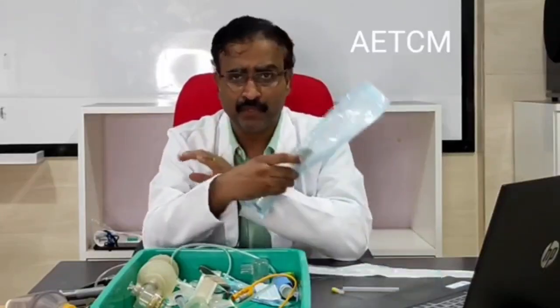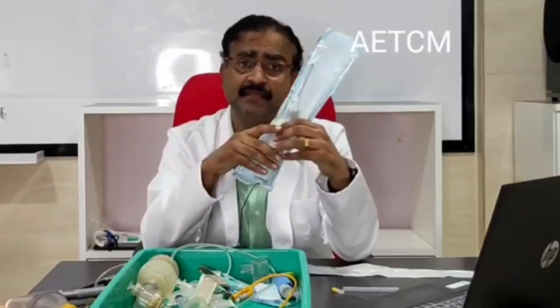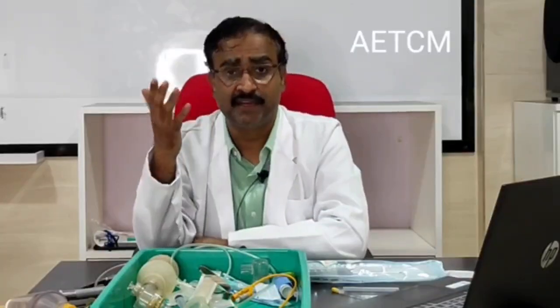Now, in children who have a probable Wilms tumor, a mass arising from the kidney, you would like to use this needle to do a biopsy of the kidney. In children who have a very difficult, refractory or resistant kind of nephrotic syndrome, you would like to know which type it is, such as non-minimal change disease. Whether it is a crescentic type or a proliferative type, you would like to know by doing a biopsy.